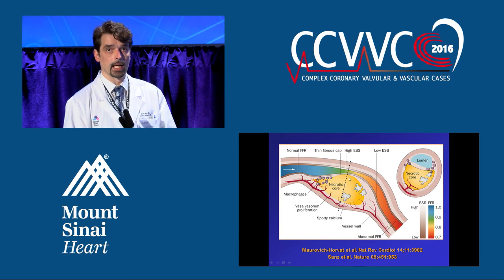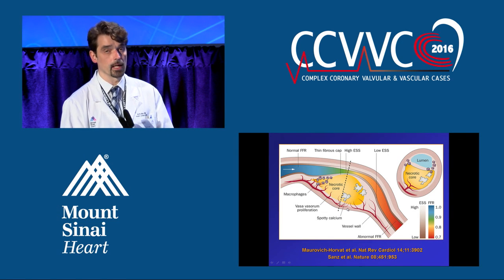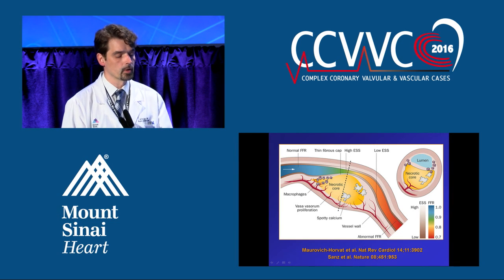So from an anatomic point of view, it's a large plaque that grows both inside the lumen, creating a reduction in the lumen area, and also is growing outwards. So this is called positive remodeling. It's one of the features that we're going to be looking at. So we're going to be looking for large plaques that cause some stenosis and that have positive remodeling.